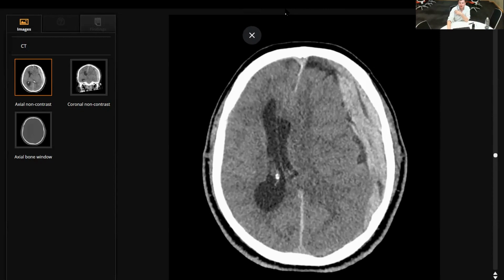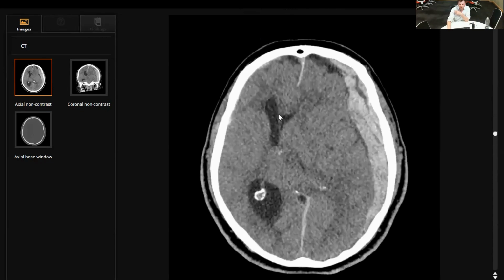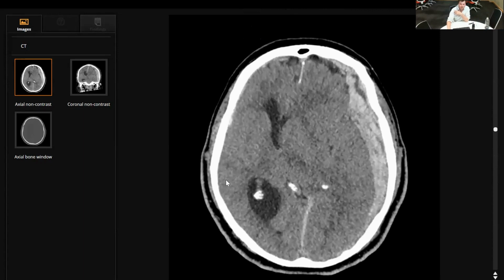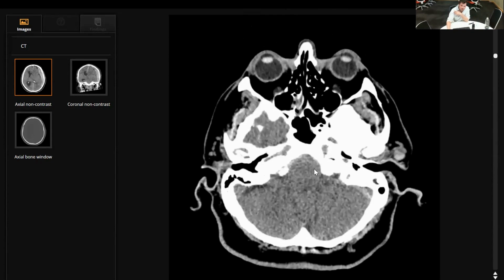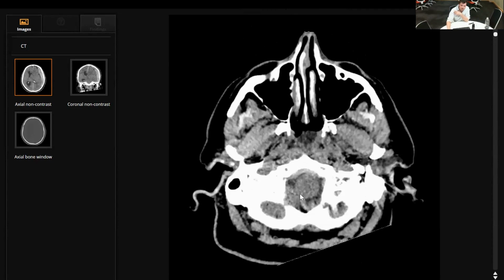So that was good. So you did a nice review, huge mass effect over here. We've got all of the sulcal effacement on this side, as well as all of this brain being pushed in. And as you come down, you're right that this is just a bit busy down here. That's not brain at the front there, so that's blood as well. So we've got blood into the prepontine cistern here.